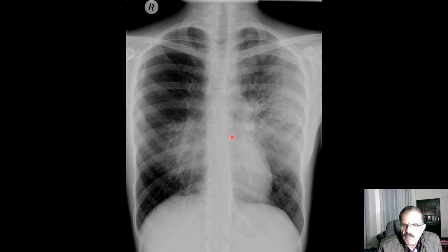Aspiration pneumonias, of course, we always relate any imaging test with a clinical condition. So if this patient is bedridden, has got high fever, then of course it would very simply correlate with that bilateral pneumonia.